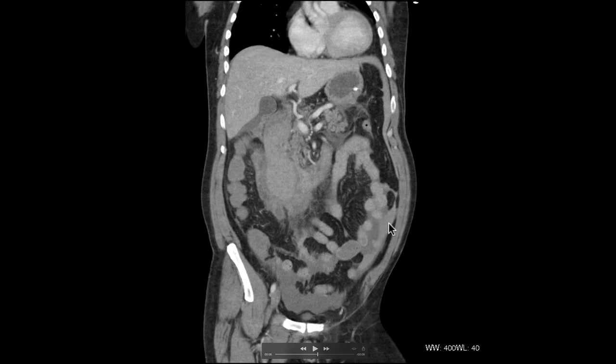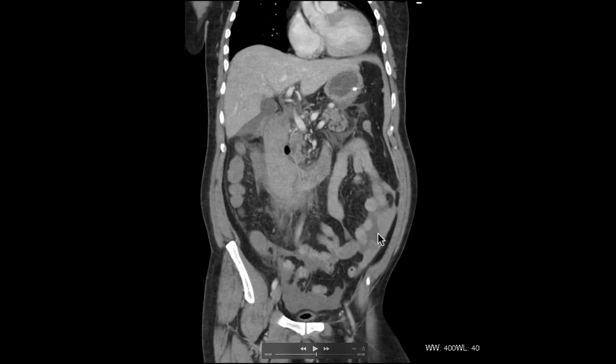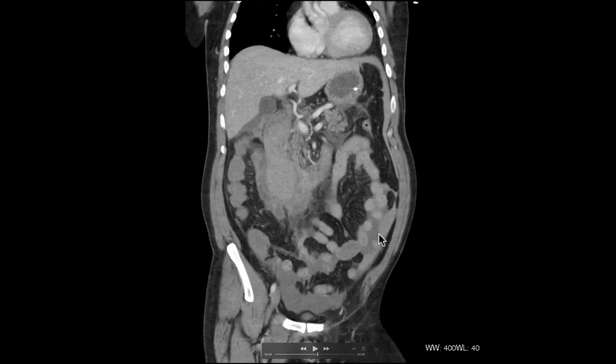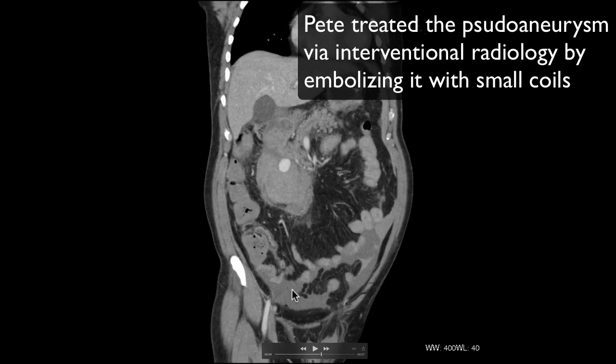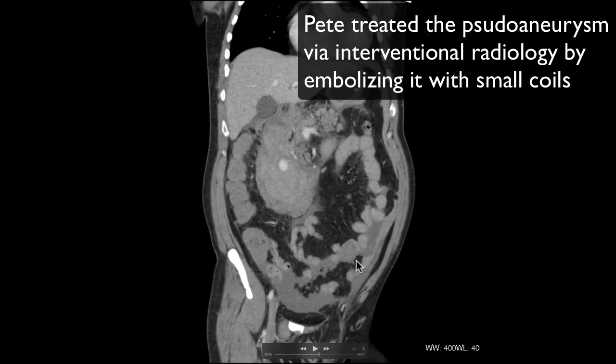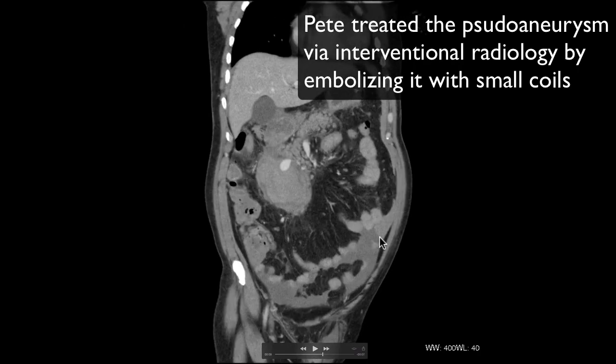This bit here is hematoma, which is similar to the blood in and around the duodenum. This darker stuff is just free fluid. You can see the difference there, and that dark stuff is much more similar to the gallbladder fluid there, whereas blood and hematoma are brighter. Completely fresh blood that hasn't clotted will be slightly darker than clotted blood, which you can see in the stuff on the left side of the abdomen.